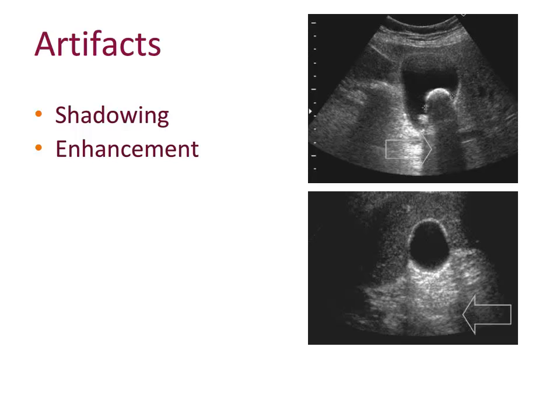For example, tissue that is deeper than strongly attenuating objects, such as calcification, appear darker because the intensity of the transmitted beam is lower at areas deeper to the reflector. In the scan of the gallbladder above, the left side shows enhancement as described above. The right side shows decreased beam intensity because of attenuation in calcified gallstones.